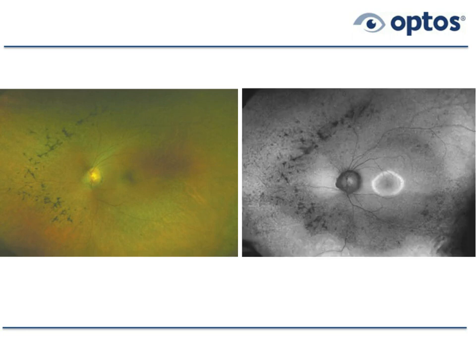But then we look at the images on autofluorescence. And we're seeing a sort of a ring, again, another one of these bullseye macular lesions, which we're not seeing with the color image. So this patient may have some symptoms of difficulty seeing at night, may actually have some problems reading. Acuity may still be good, but that bullseye lesion will typically get smaller and smaller and smaller. And as it gets smaller, it gets closer to the fovea and will wipe out the fovea. So that's an active lesion that will continue to create problems for this patient, and the patient has it in both eyes.